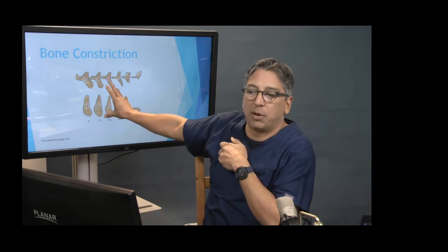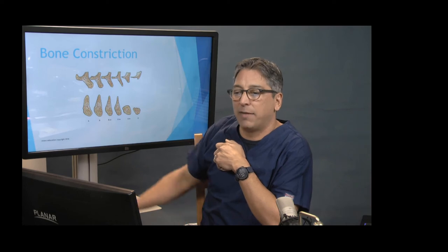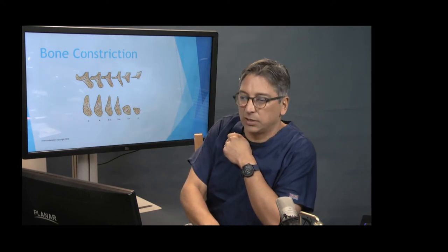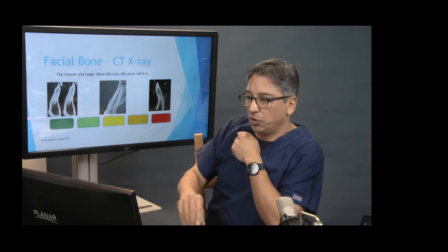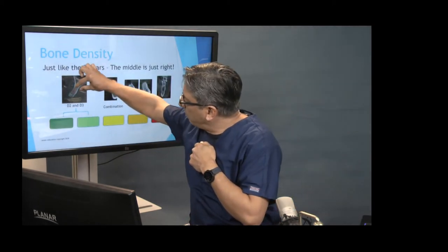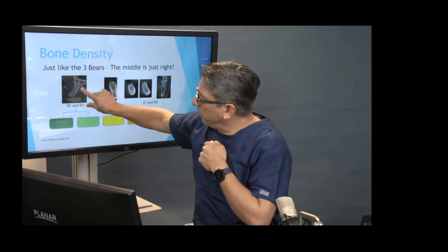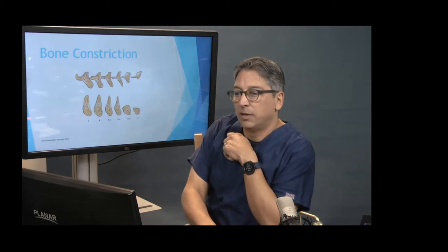So this is more about bone anatomy. That's kind of a given. It's not something I have on my list. The bone constriction I talk about relates a little bit more to this case here, where you can see it kind of going fairly parallel, and a little bit of an indentation here. So let's look at that.